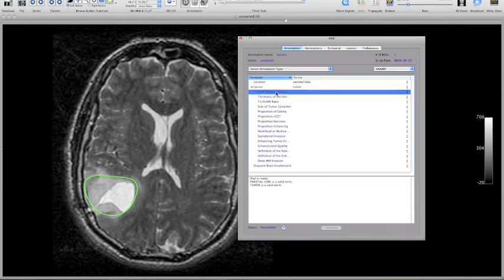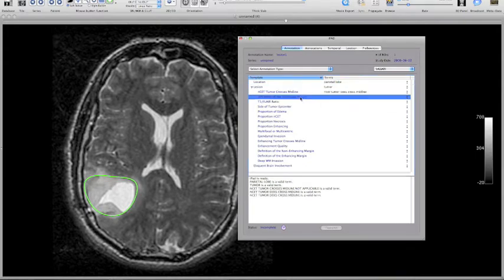And then there's a number of sub-features that I can annotate as well. Let me open up the window here to show the full terms. So for example, does the tumor cross the midline? And in this case, the tumor does not cross the midline, or it's not applicable. And again, this brings up a number of drop-down menus that I can use to quickly enter the annotations. I'll put in a couple more here. Thickness of the enhancing margin. This one really does not have an enhancing margin, so I click no enhancing margin. But I could choose other options if I wanted to.